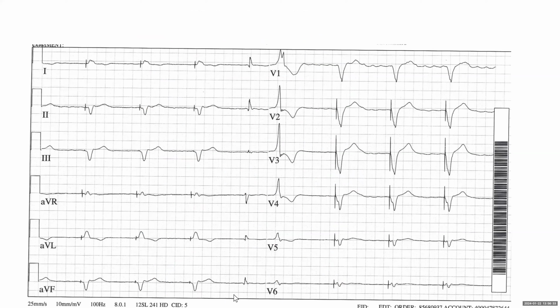That's why it was conducted. So the patient doesn't have complete heart block, just AFib with slow ventricular rate. And then you have one beat that comes early and is conducted with aberrancy. This is probably what's happening here. But technically, without knowing the baseline, you can't tell. Good. Any other questions about the ECG?